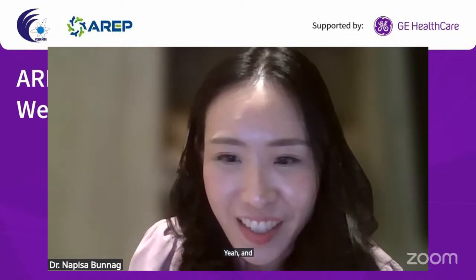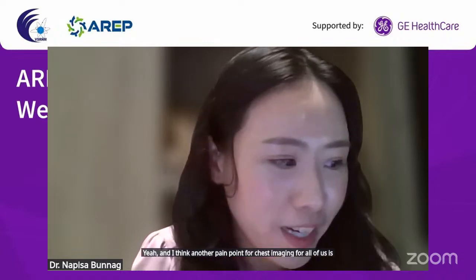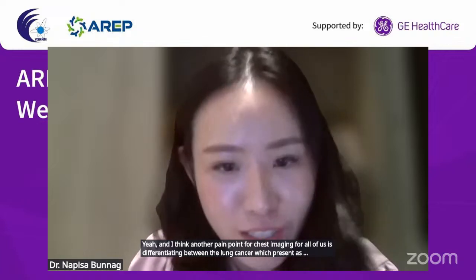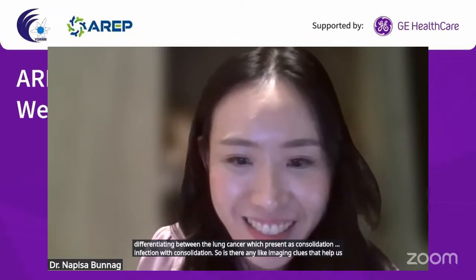Yeah, and I think another pain point for chest imaging for all of us is differentiating between lung cancer, which presents as consolidation, and infection with consolidation. So, are there any imaging clues that help us differentiate this? Yeah, that's important. There have been some papers in the past which talked about bronchial dilatation being more common in cases of consolidation caused by adenocarcinoma.